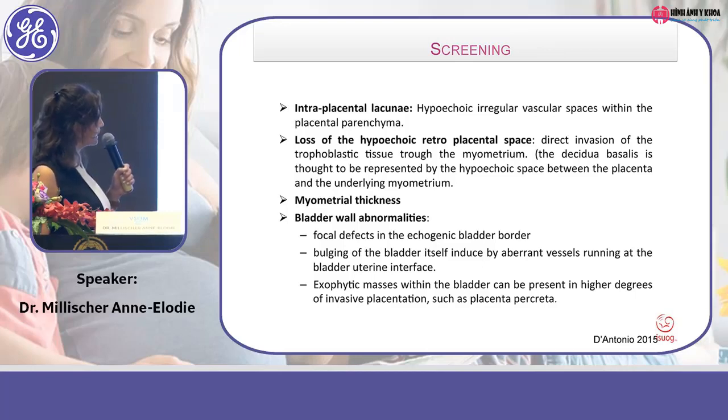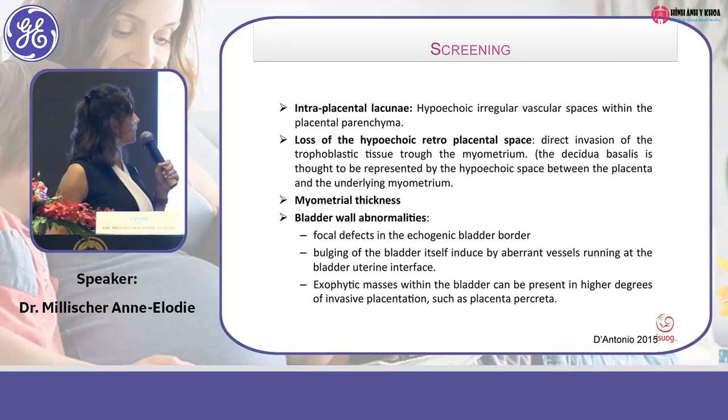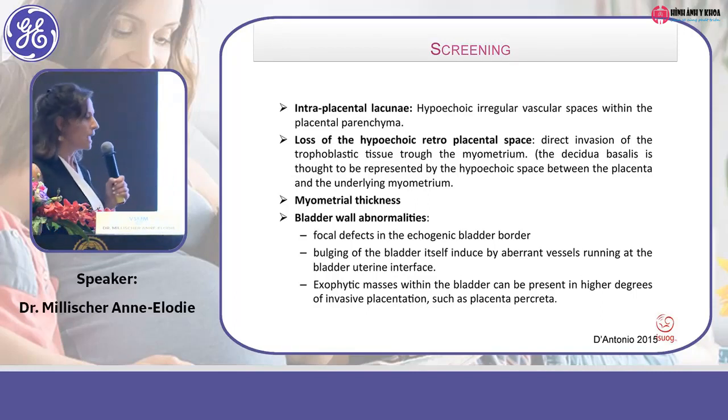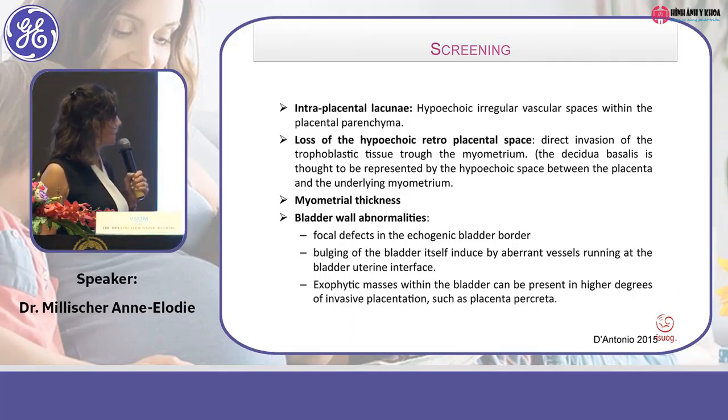Here you have little vessels just in the space between bladder and placenta, and there's a frequent hypertrophy of those vessels. Và các bạn thấy các mạch máu nó đi qua nhau, bám tới gần tới bàng quang luôn. So the myometrium just in front of the placenta is very, very thin. Và cái cơ tử cung nằm ở cái vị trí mà nhau cài đó rất mỏng.